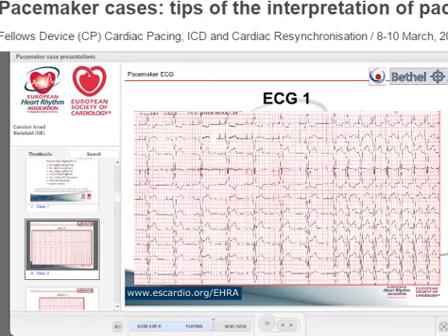And now you've already heard the mechanism. Why does this patient suddenly develop endless loop tachycardia, pacemaker-mediated tachycardia? Maybe this is the only paced P wave that is visible from the end of the room. At the beginning, you see it here in lead II: atrial spike, P wave after it, here no longer, and already you see a retrograde P wave, which is so early that it is still in the refractory period and doesn't trigger PMT.